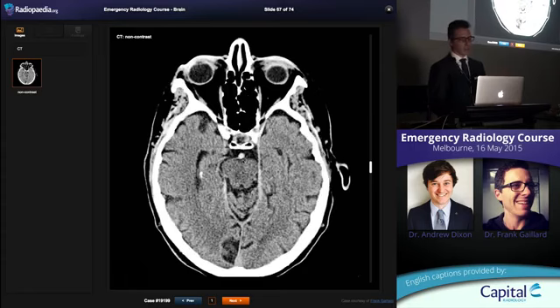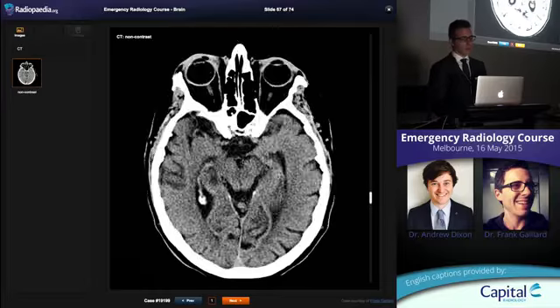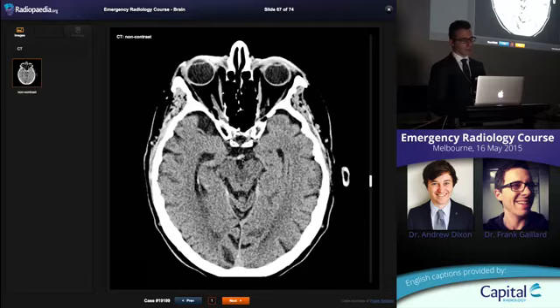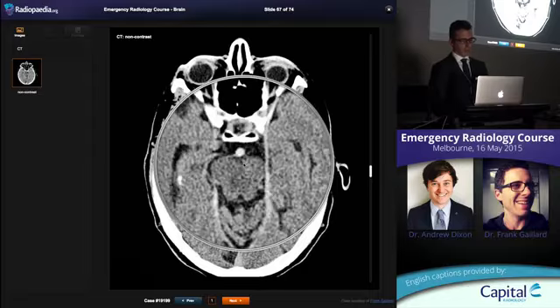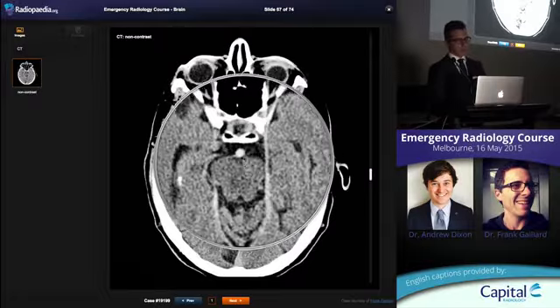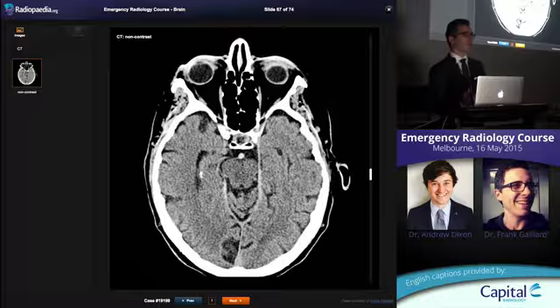But whenever there's the concern that there might be basilar occlusion, you need to look at your non-contrast studies very carefully. And the key is to look for hyperdensity at the top of the basilar. If we just scroll down, see the difference in density? So this is the opposite of the CTPA Andrew showed, where you've got a vessel that suddenly changes density. Top of basilar is another endovascular emergency. If you can fish this out, you can save a life, hopefully.